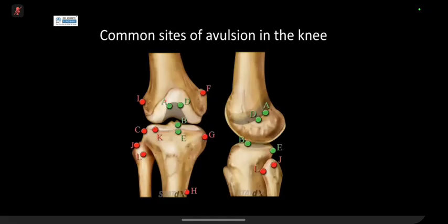So your A and B is your ACL, D and E is your PCL. You've got your LCL, capsular ligaments kind of here. You've got arcuate ligaments, so your Segond fractures, reverse Segond, deep meniscotibial ligaments. You've got your arcuate sign, so part of your posterolateral corner. You've got your conjoint tendons, so a combination of LCL and biceps tendon insertions. There's the proximal attachment. Similarly on sagittal, so similar sites. So these are common sites of avulsion. There is a very nice paper called Pediatric Avulsion Fractures in the Knee. If anyone's interested, you can have a look at that.